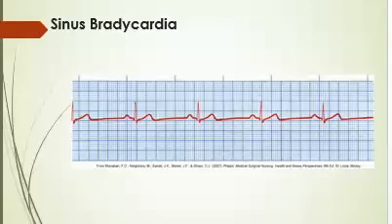Absolutely, this heart rate is 40. Like I said, even though it sometimes is not the actual heart rate, this heart rate could be 42. This heart rate could be 38. Either way, I don't like it. A lot of things could cause this: beta blockers, ischemia. It could be normal for athletes, or drugs or something like that. So this is your bradycardic patient.